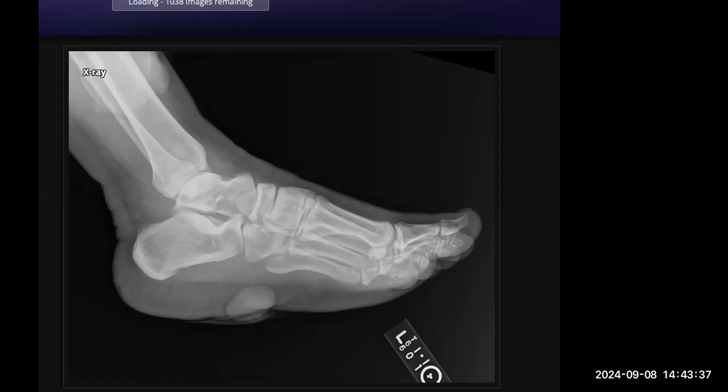This could be something in the distal leg region also. It's in the subcutaneous location. This could be a fibroma, neurofibroma, if the history is relevant.